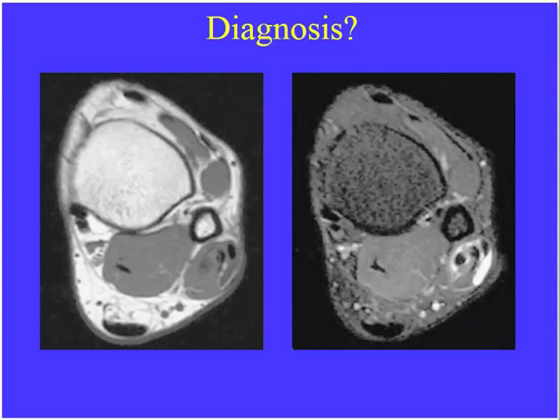Okay, now what if you get something like this? Here's an appearance. We have a cross-section. We have a T1 and a T2 weighted image. And if they show you this image, it's probably going to be a tendon abnormality they're looking for. So how are you going to hone in on what's abnormal? Well, what I always do is I go to my T2 weighted image and I look where there's some bright signal. If you look for the bright signal on the T2 weighted image, that's typically where your abnormality is. So we come over here and that localizes the abnormality to the lateral aspect. Here's the fibula. Here's the peroneal tendons. We have high signal around the peroneal tendons.